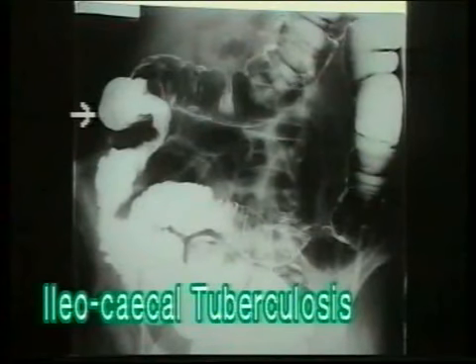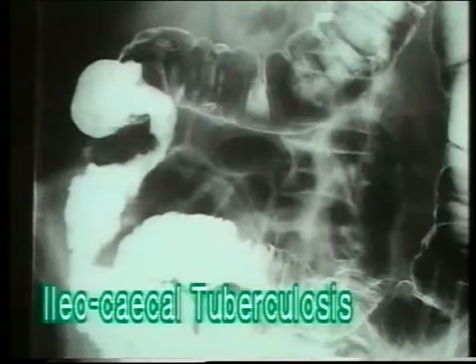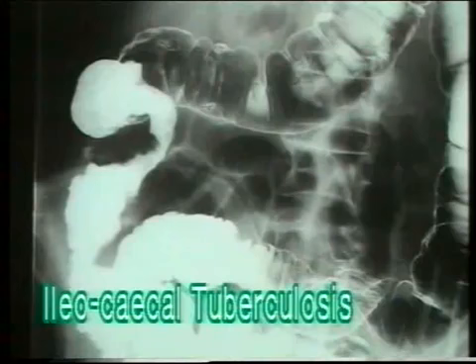In this X-ray, the arrow points to a contracted cecum which is pulled up almost up to the hepatic flexure. The terminal ileum shows a long, narrow, spastic segment. Proximal to it, the ileum is dilated. The transverse and descending colon are normal. This is ileocecal tuberculosis.